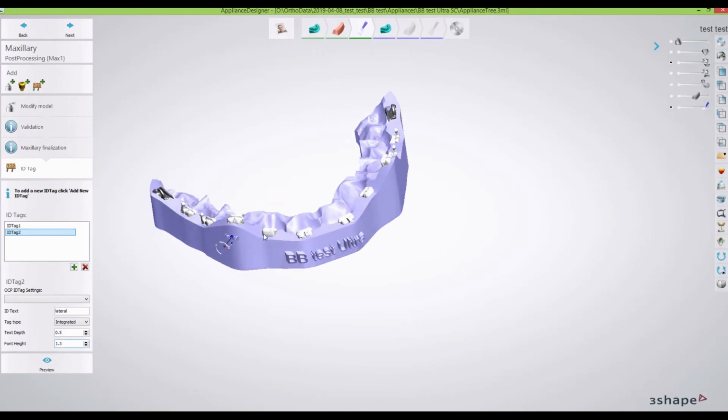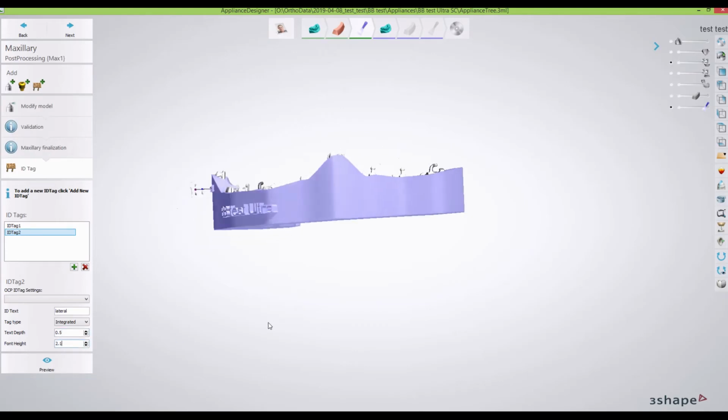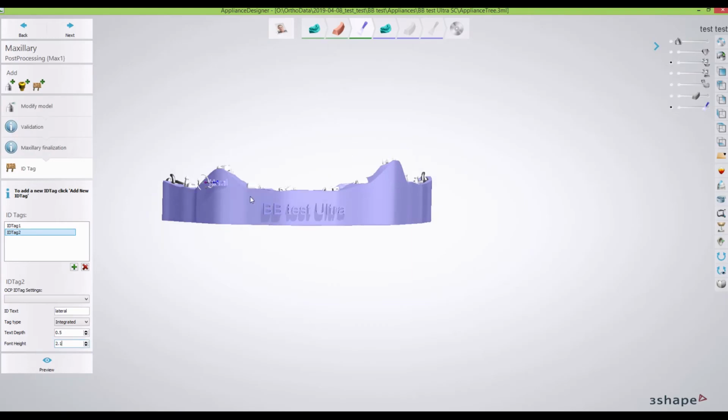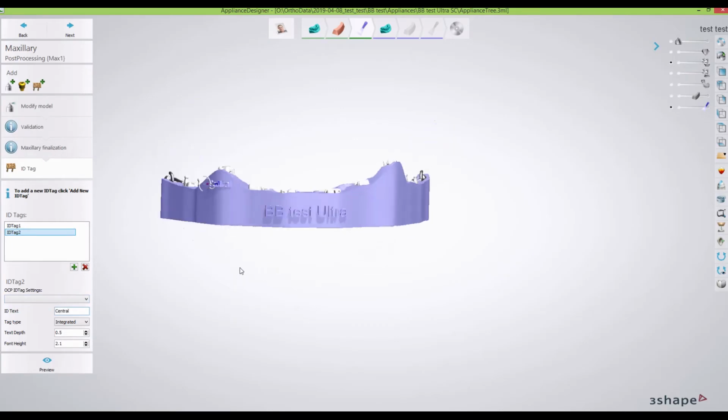And that might be a little too small. Then we can keep it inward, but let's make it a little bit bigger. You can see that's going to adjust that there. So what I could do is I could do that for the inverted. Oh, that's not a lateral. Don't let me do that. Shoot, that's actually a central. I was going to edit that part out, but now it's much more authentic. Yep, that was a central. And there's the inverted lateral.